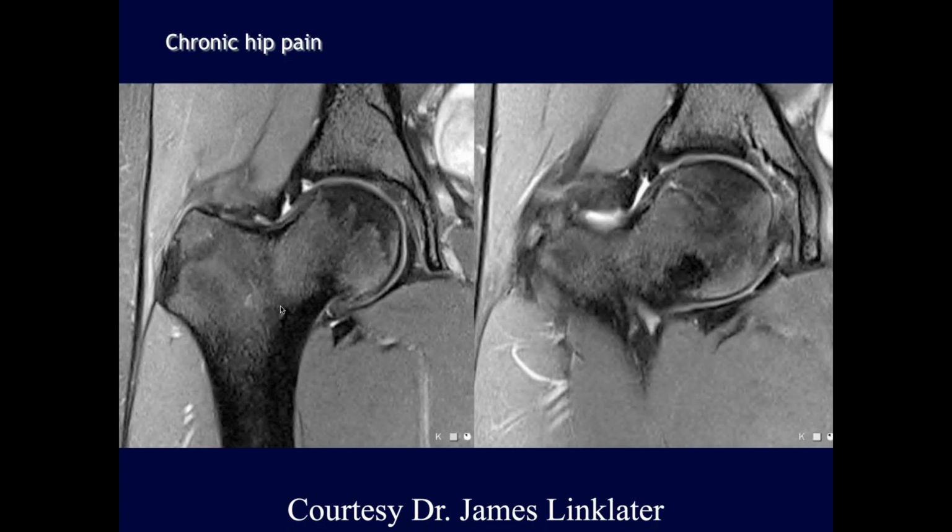Okay, Michael. Okay, chronic hip pain. How old is this patient? Because I'm looking at the epiphyseal plate, it's closed, but it doesn't look normal at all. It's markedly irregular, kind of jagged.